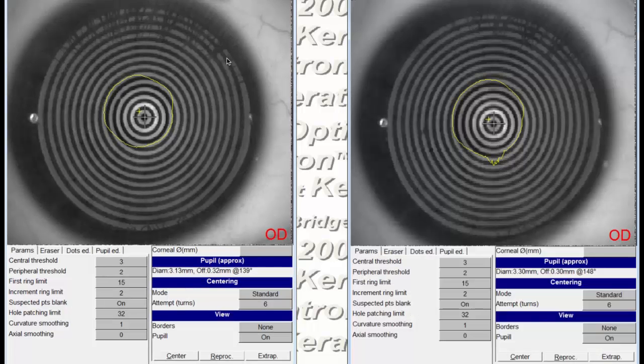So the better of the 2 maps is still here on the left side. I've opened up the next one, and again this one compared to the one on the left is just a little bit more rough around the edges, and so I'll close this one out. And I'll do this 1 against 1 process of elimination until I'm left remaining with my one best map.